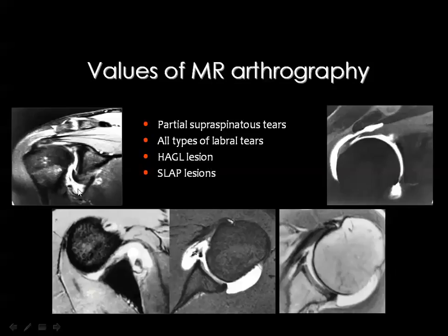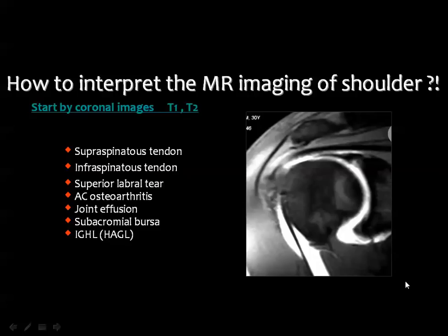You want to distend the axillary pouch to see this ligament and whether it is disrupted from the humeral attachment or the glenoid attachment. Also, it's very helpful in evaluation of injuries of the superior labrum, particularly when these lesions extend into the tendon of the long head of the biceps.